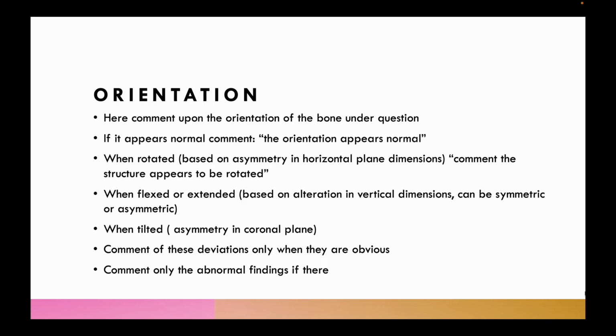We'll be coming to the examples and comment only on those variations which are obvious in the radiograph. Do not comment upon the minor changes which may not be picked up well by the examiner, and comment only on the abnormal findings if they are.